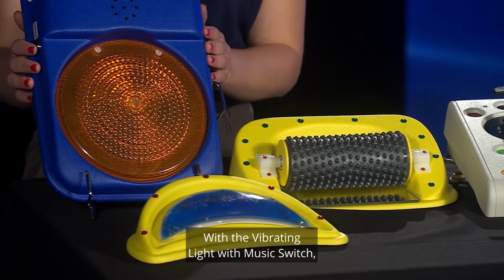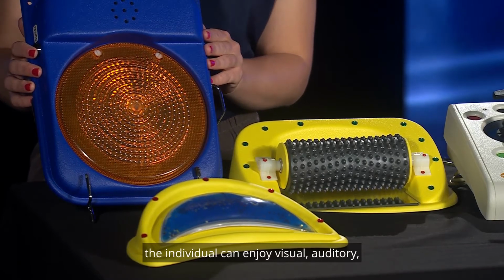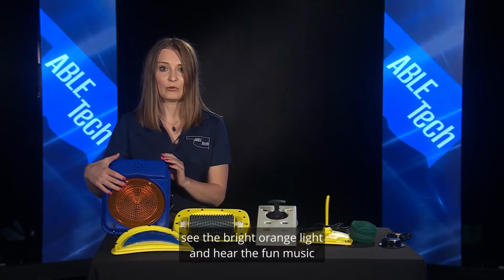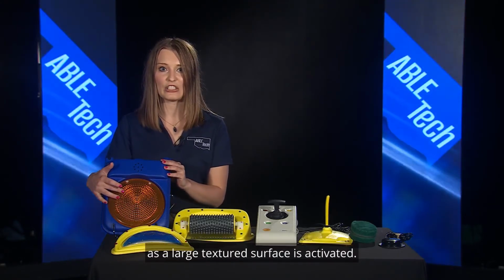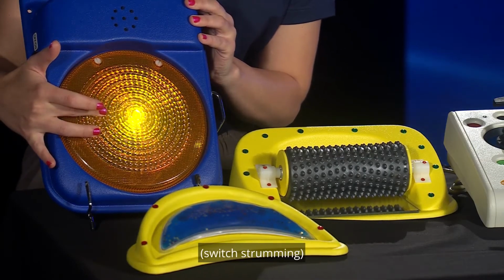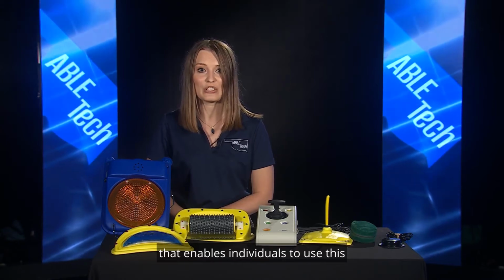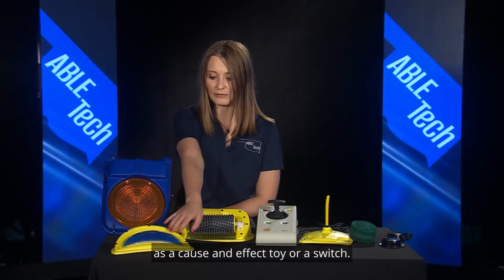With a vibrating light with music switch, the individual can enjoy visual, auditory, and tactile sensations. See the bright orange light and hear the fun music as a large textured surface is activated. The Gushy switch is a soft, squishy, sparkly pillow that enables individuals to use this as a cause and effect toy or a switch.